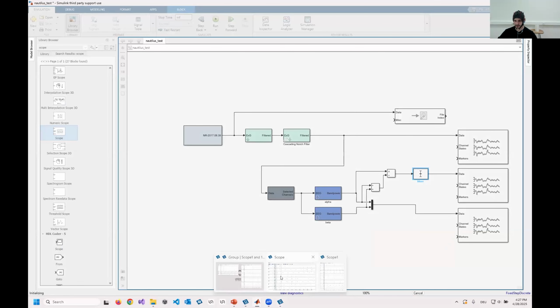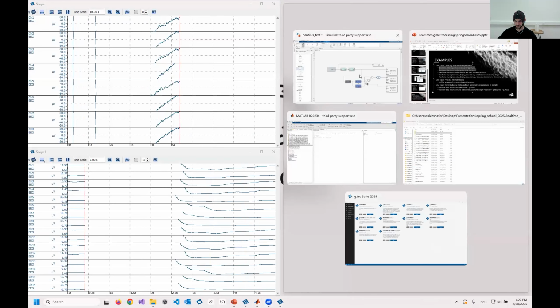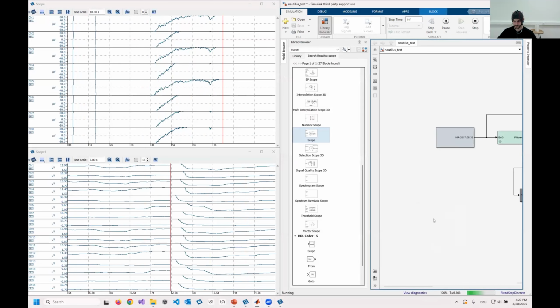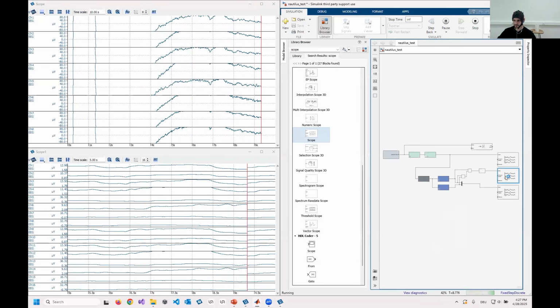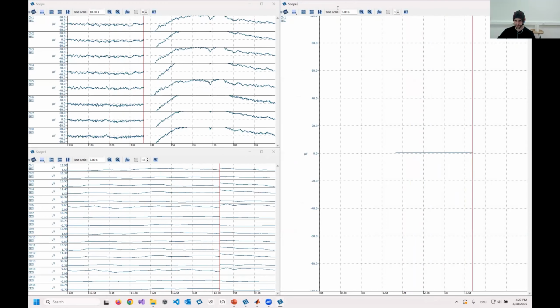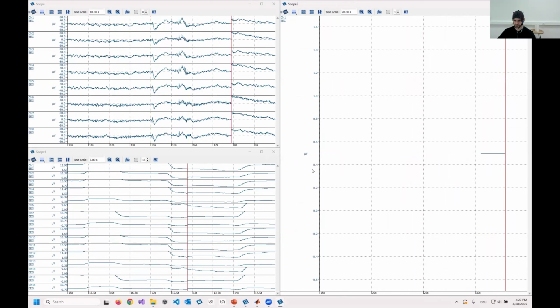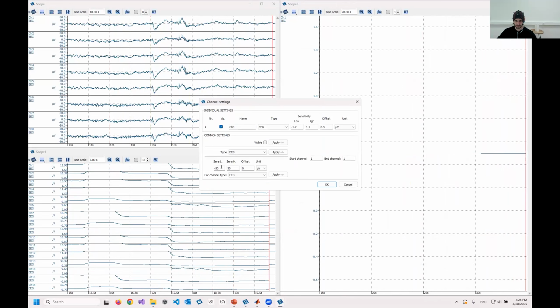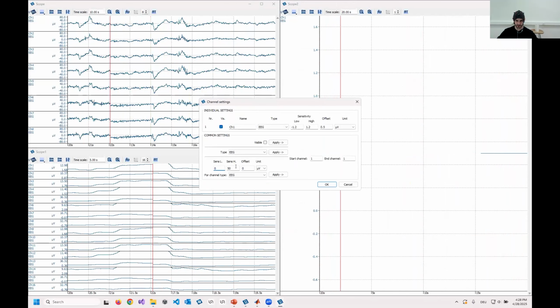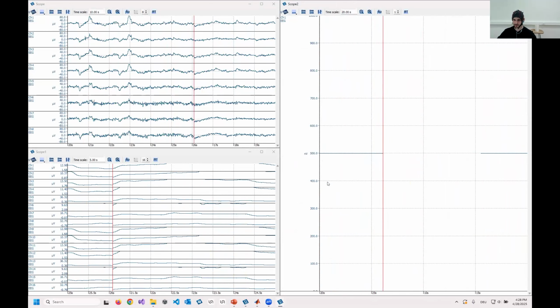The model is up and running. And we can just follow the third path. I'm going to scale it from 0 to 1, because now we will get a ratio in between 0 and 1.